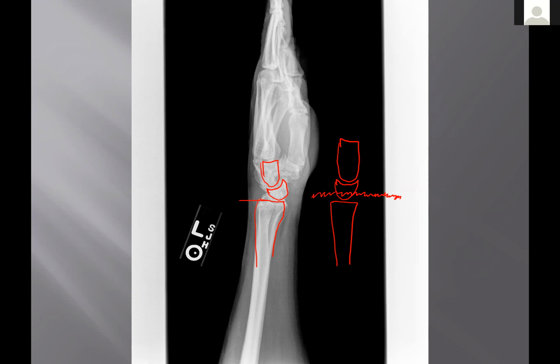Dorsal. Yeah, it's dorsal tilting of the lunate. And you know that when you get that wide scapholunate joint, the whole wrist destabilizes. There is not a finding in the wrist, other than a scaphoid fracture, that's more important to see than a wide scapholunate joint and a dorsal tilting. It does very rarely tilt ventrally, but most of these are dorsal tilting.